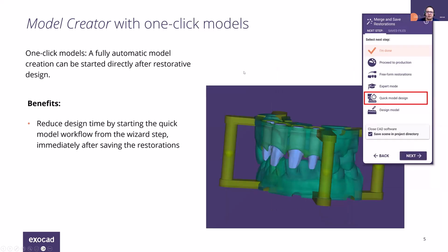And again, with ModelCreator, when you reach the end of your design, there will now be an option for quick model design. This is a simple one-click operation for the design technician to allow the software to generate a model for you automatically.